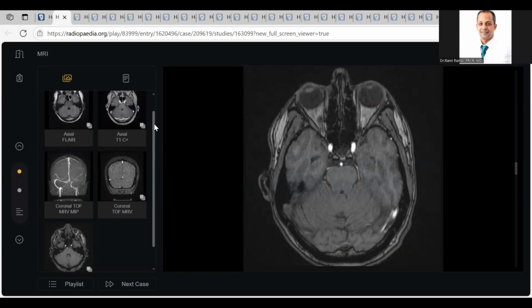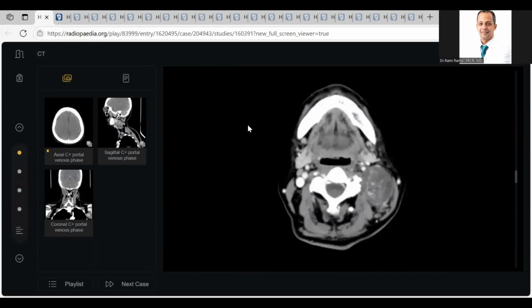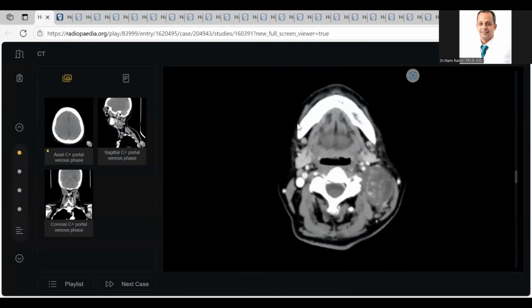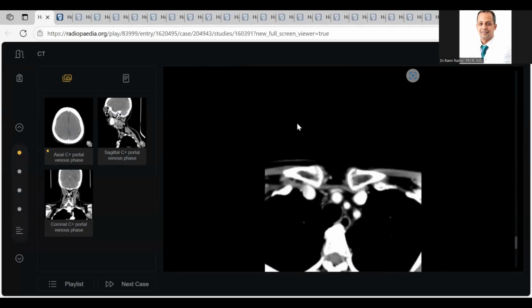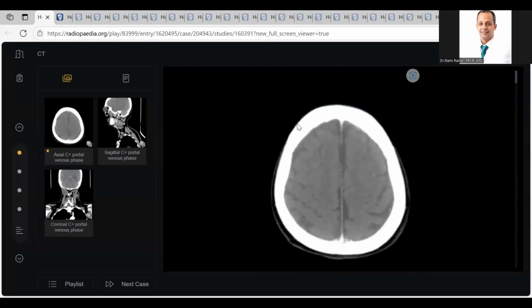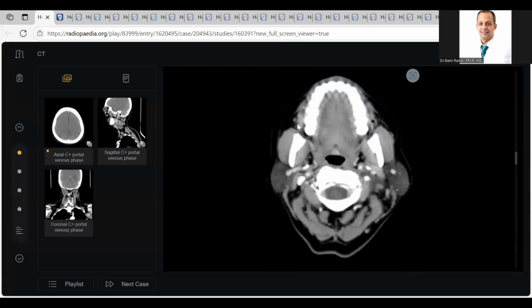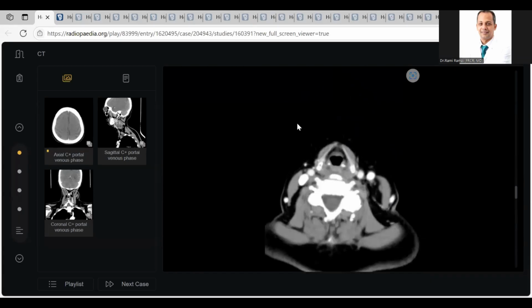In this case before, this case is a classic case. Okay, but where is the trick here? This looks like a brain CT. Okay, if you didn't examine or see all cuts till the end, you will lose it.